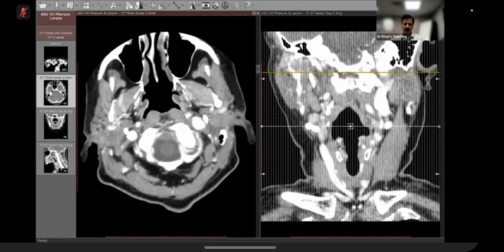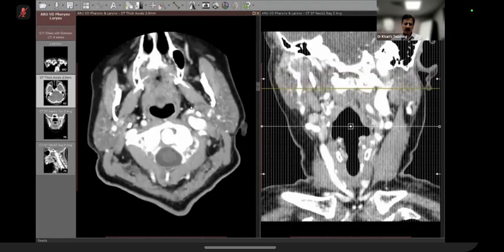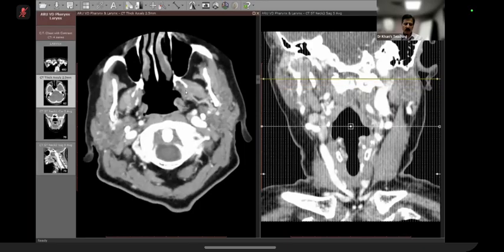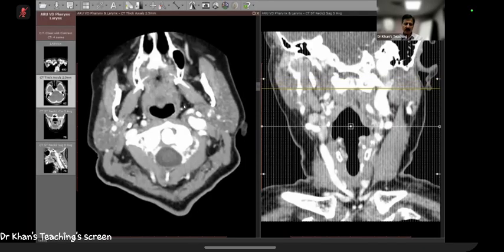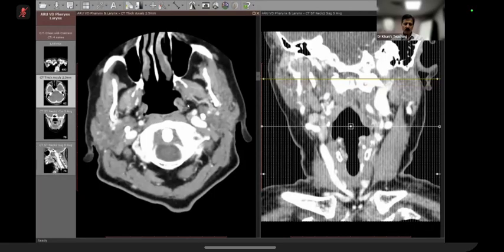Now, this, on the other hand, is the parotid gland and the deep lobe. And you can see that it is sitting here. Now, this muscle is the pterygoid muscle, the medial and the lateral pterygoid, and this is anteriorly placed. And here is the pharyngeal mucosal space.